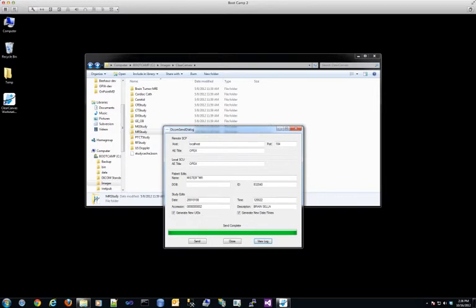This concludes the DICOM send capabilities of the Study Analyzer tool. Thank you.